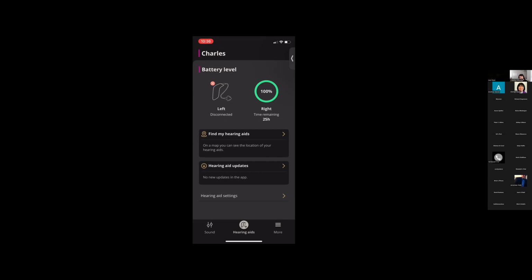What they will do is take your hearing aids, check the tubes, and make sure that the firmware update is where it should be, and then they'll often check your battery for you, just because while they're in there, why not? So I would not touch this button, simply because I haven't had a good experience. I've had hearing aids twice now that didn't update correctly. That's not to say that it couldn't work in the future, but for right now, I would avoid touching it.